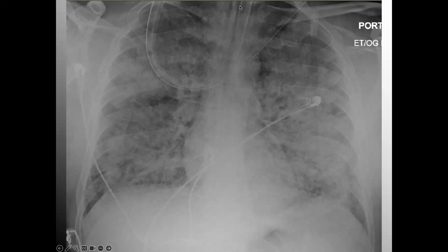So it looks like my ET tube is here. The airway appears to be somewhat midline. I do have a little bit of curvature of the spine. I don't see any obvious breaks or fractures or severances or complete changes in direction. The patient could be malpositioned in the bed, maybe a little scoliosis. I don't know their history.